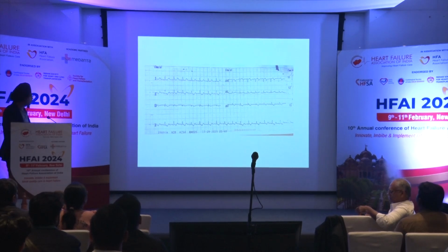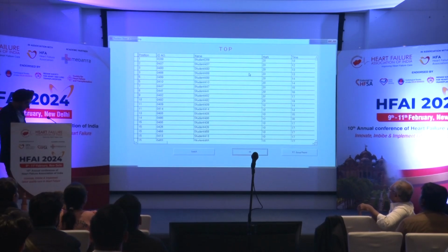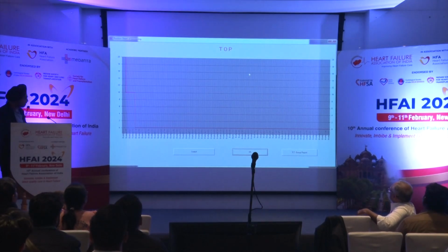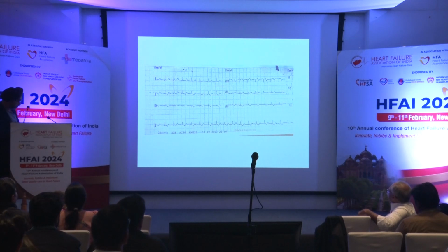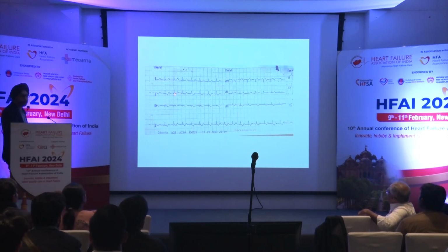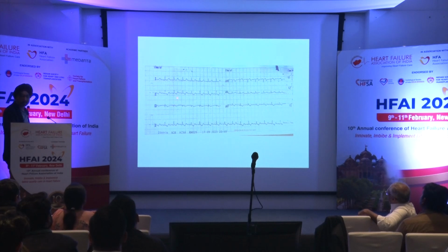So it can't be a sinus tachycardia. Can it be a sinus tachycardia? We don't need all these things. So if you look at this P wave, it is just outside the QRS, right? Clear? And then it is followed by a T wave. Now this PR is not possible. You can have such a long PR, but then it is not a sinus P wave. It is an inverted P wave, so it cannot be a sinus P wave.